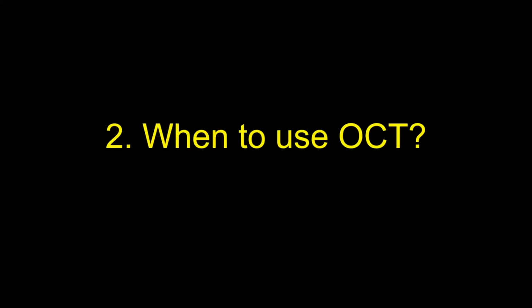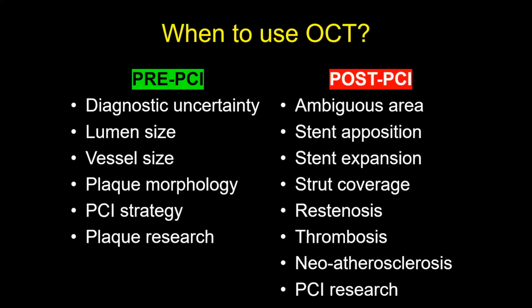Okay, so when to use OCT? Obviously, it's the resolution. I usually say that there are reasons that you need to do intracoronary imaging, and especially OCT. It depends on whether you have the reasons at angiogram or after you have an angioplasty. But the main one before angioplasty is diagnostic uncertainty. You're not sure what you are seeing. If the angiogram shows a hazy area, unclear what you are seeing, then you can get a certain tissue diagnosis and plaque diagnosis of what it is.